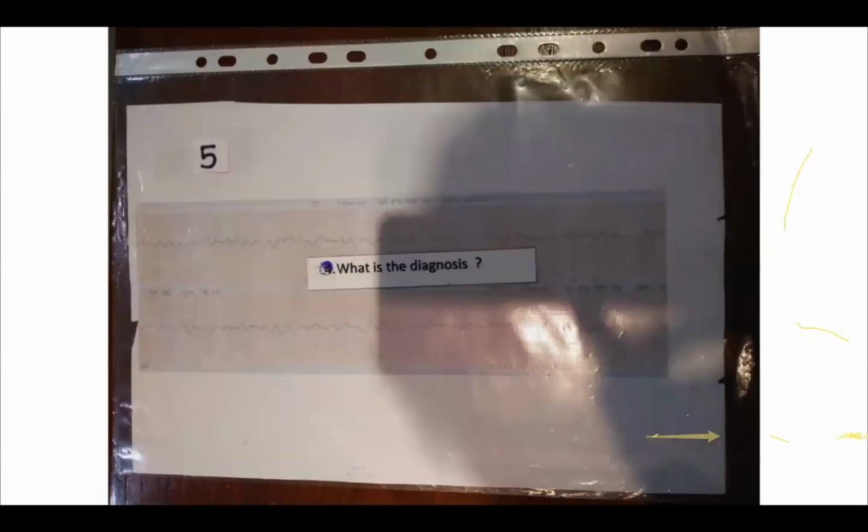So what is the diagnosis here? This is a spot diagnosis. VF, ventricular fibrillation. Each and every one of you must be able to diagnose VF, because prompt and proper delivery of shock will save the life, right? Even if you shock after about 10 or 20 minutes, it's too late. That's why during CPR, as soon as possible, you have to connect the patient to the monitor just to see whether it's a shockable rhythm.